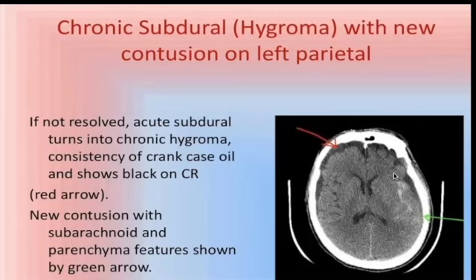So now, do they have any sort of edema? If I want to make sure if they have any edema, I should start looking at the midline. Since I don't see any issues with the midline, I should notice, oh, this patient doesn't have an edema, but they have some subarachnoid bleeding because I cannot see mirroring images of the sulci.